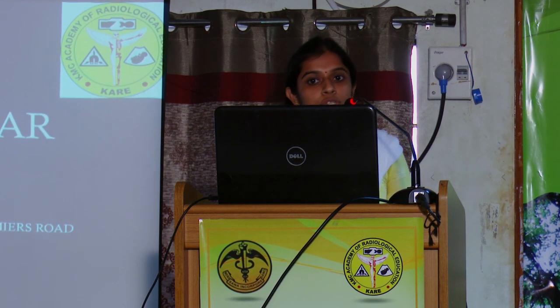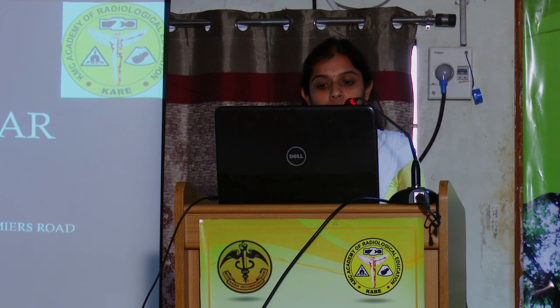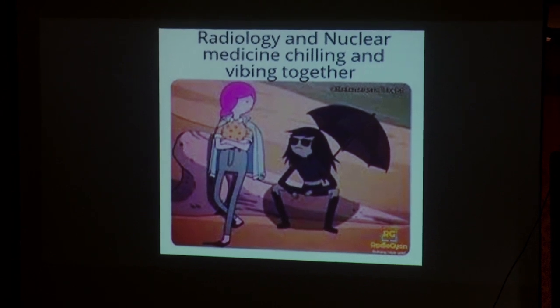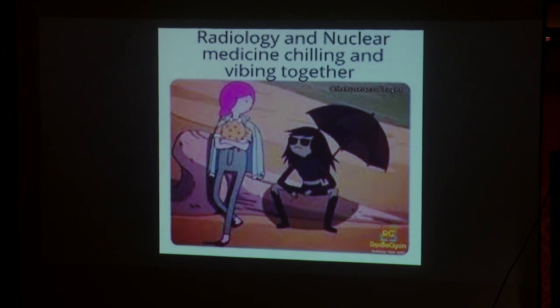For the next 30 minutes or so, we'll have a look at a few nuclear medicine cases. I think most of you would have come across this. In recent days, radiology and nuclear medicine go hand in hand. Most of the cases are fusion images, so we get better anatomical information as well as the metabolic activity picked up with the help of fusion. Here we will look at both fusion imaging as well as planar imaging.